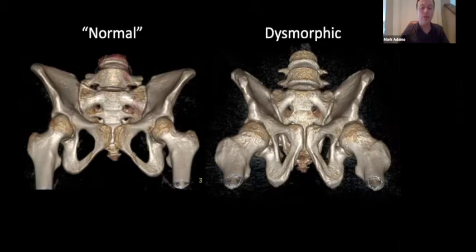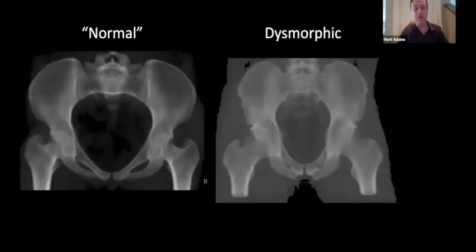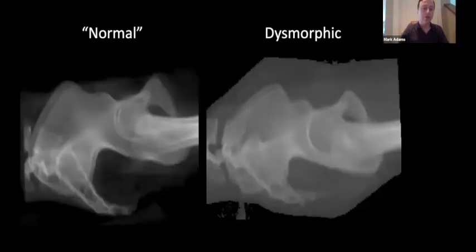Furthermore, the upper sacral segment is not as recessed in the pelvis. On the inlet view, we also see a difference at the sacral ala. Radiographically, there is a cortical indentation of the anterior ala on the inlet radiographic view, which is represented with these arrows. To further understand this acute alar slope, we're going to look at the lateral.